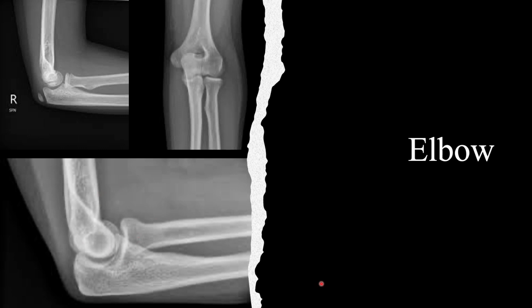So worry about the adult x-ray for now. Everything here that is said goes for the pediatric as well. You want to make sure that the long axis of the radius intersects the capitulum. So the long axis of the radius intersects the capitulum here. So the capitulum, the head of the radius, you want to make sure that it goes right through the middle. You want to look at the fat pads. So the anterior and posterior fat pads should not be displaced. It's very, very difficult to see it on this x-ray.